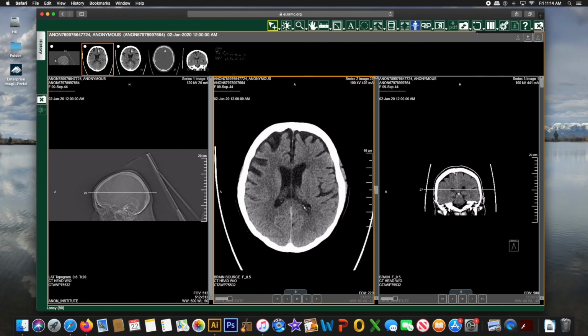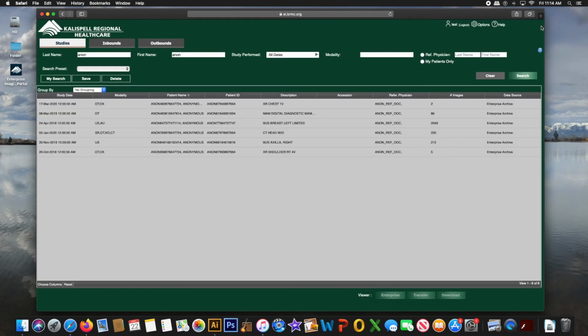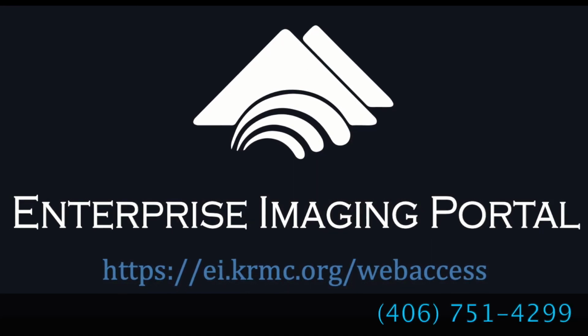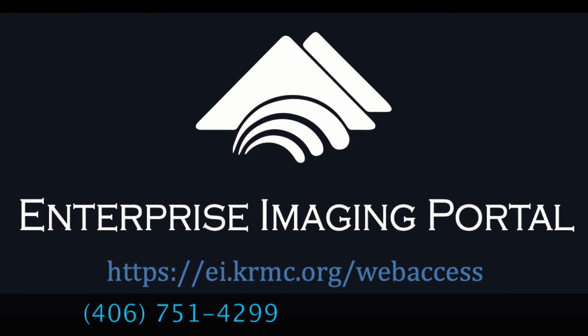This concludes the introduction video for the Enterprise Imaging Portal. If you have any questions or would like more advanced training, contact the Kalispell PACS team at 751-4299.